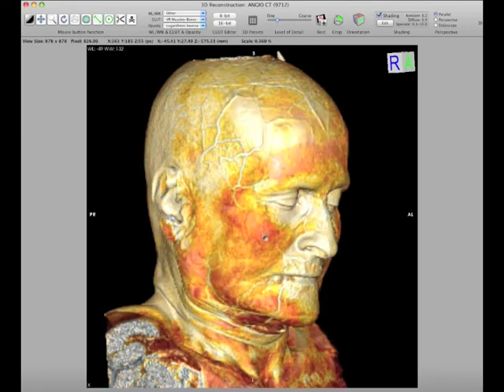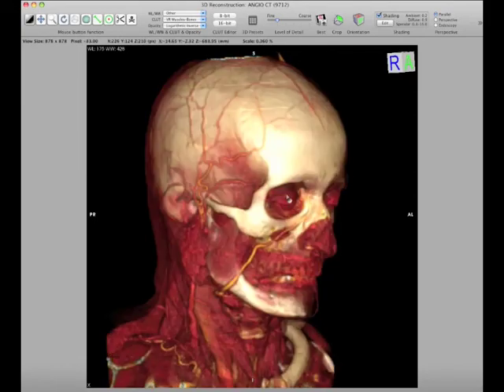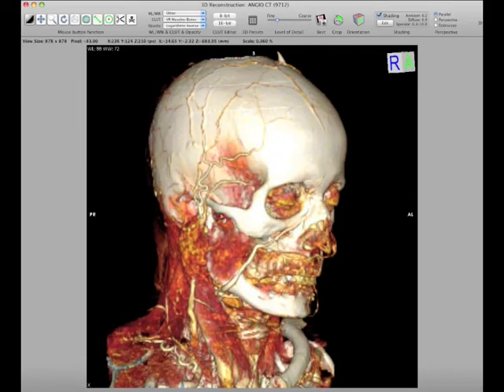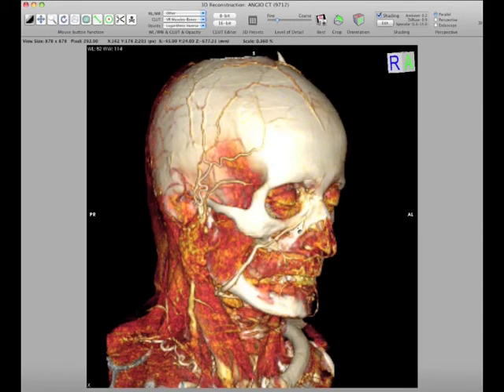Bring back the face and hit Command-Shift-3. And these are all perfectly registered when you bring them into Photoshop. Okay? And you could get something in between where we had all these wonderful vessels and even some of the parotid gland and the eyelids and stuff like that. All right? So we could do Command-Shift-3 again. And we would have those images and we could composite them in Photoshop, including the cross-section.